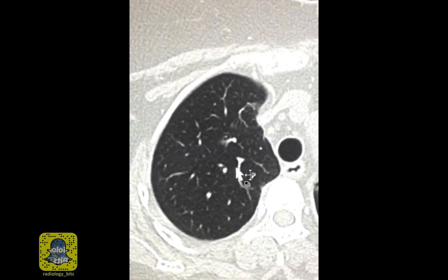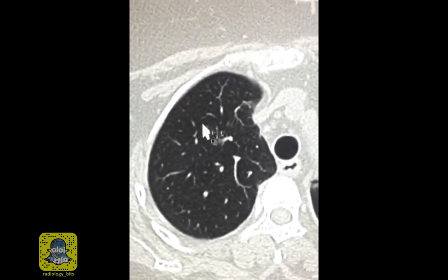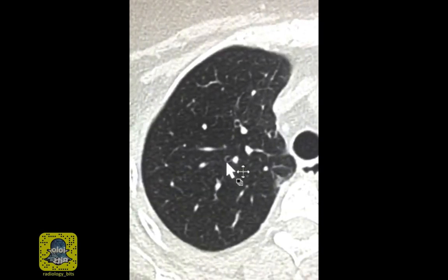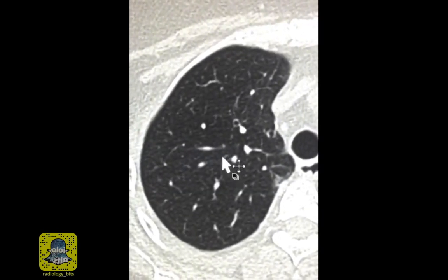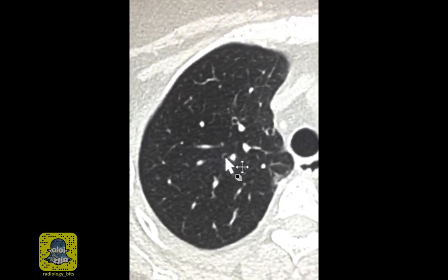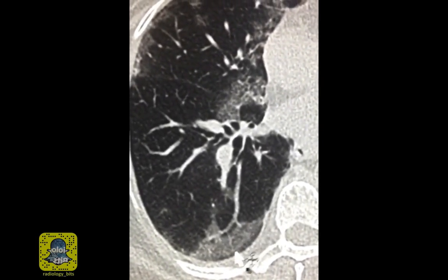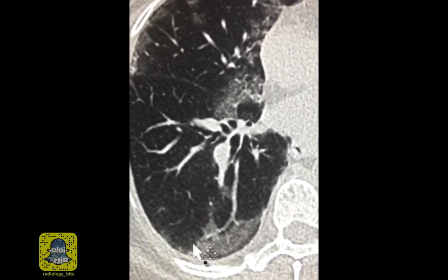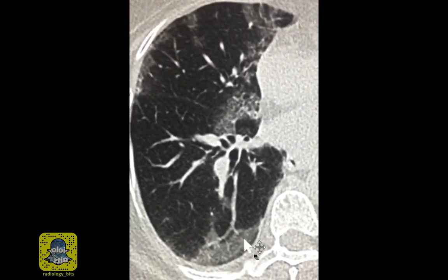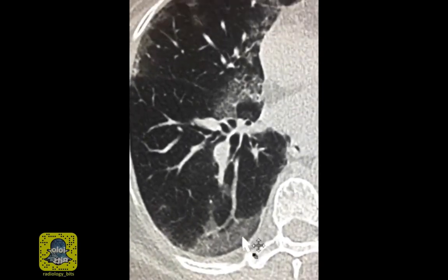This is a high-resolution chest CT. On such a chest CT, the lungs should appear dark, apart from the white of the vessels. You could also identify the white circles that represent the wall of the small airways. This means that this area of whiteness here is abnormal. And this is what we call airspace disease. So an area of increased lung density is called airspace disease.